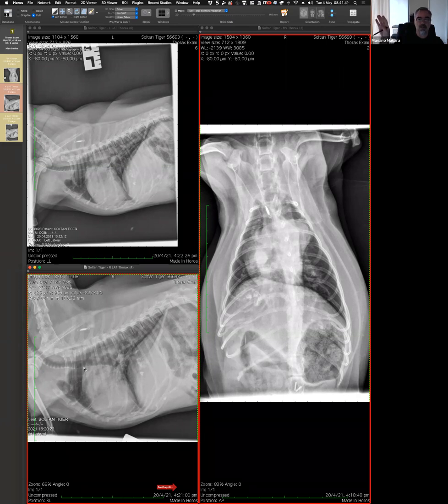So the pulmonary arteries and veins were hugely enlarged. There was enlargement of the left atrium. And basically we said that there is a left to right shunt, and therefore the pulmonary arteries and veins look very distended. And the problem was basically on the left side of the heart. Makes sense? The left atrium. Blood is going out from the left ventricle. There's a volume overload.